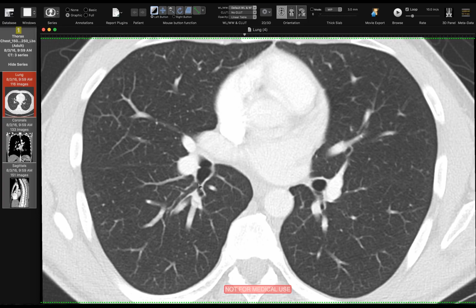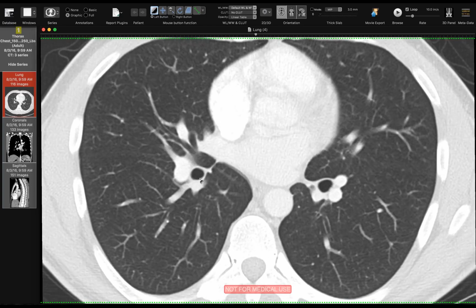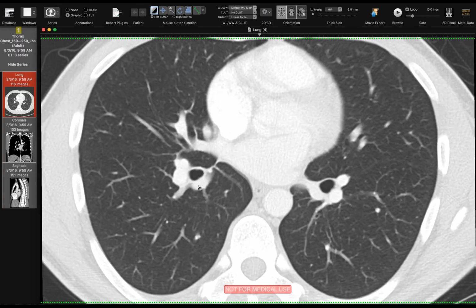Okay, so after the superior segment comes off, we have this bronchus here, and this is called the truncus basalis. The truncus basalis is the branch of the right lower lobe after the superior segment that gives rise to all four of the basilar segments. And the order in which the basilar segments branch can be remembered with the mnemonic MALP, M as in Mary, A, L, P. Okay, so let's follow this truncus basalis down and see what happens.